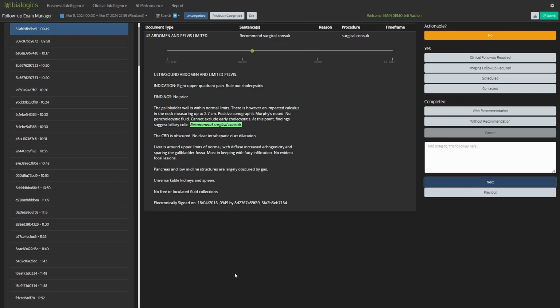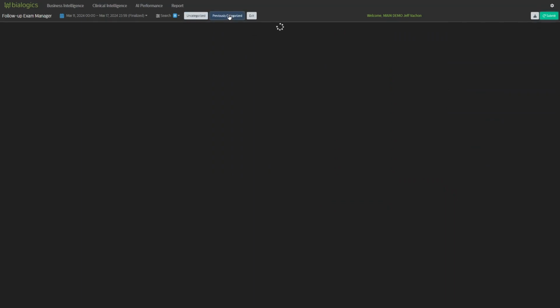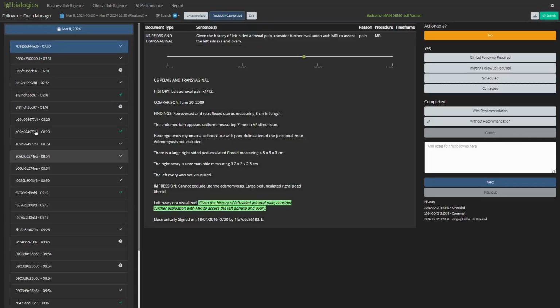And so as I'm working as a navigator, I'm going to go through my day and I'm going to be able to identify what needs to be done, schedule those patients in an effort to take the follow-up exam from the typical industry 30 to 35% follow-up to a level of 65. So let's try in every effort to prevent those patients from falling through the cracks, not coming back at the reported time.